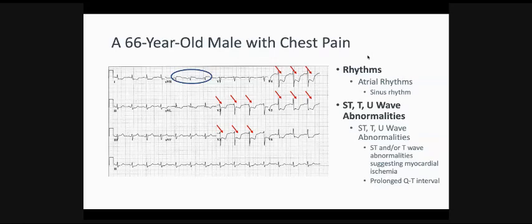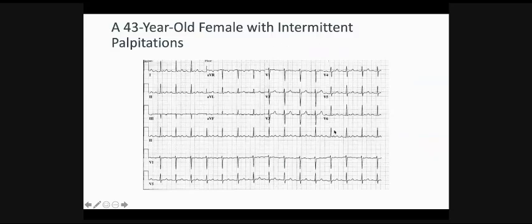And keep in mind that the ischemia comes in with other things like a prolonged QT interval, or sometimes with an AV conduction abnormality, whether it's a first or second degree AV block. So ischemia has never been an ischemia by itself. It usually comes with either a prolonged interval somewhere or an AV conduction abnormality in other leads. But excellent, so you got this, but keep in mind that there is a prolonged QT interval on top of that.